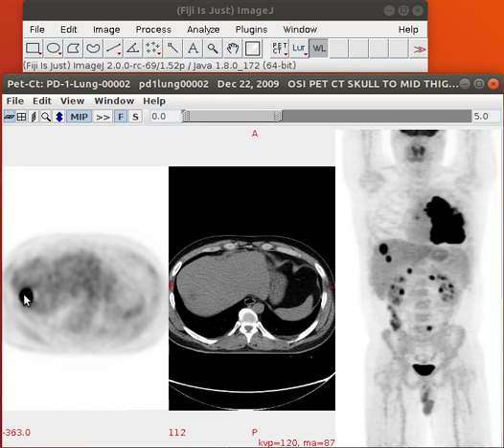Now if I click here, this is the mean in this tumor. Well, the mean is big. Look at the standard deviation, it's huge. Why? Because you've got this hot spot and you've got this very low area. This is not very useful for an average.